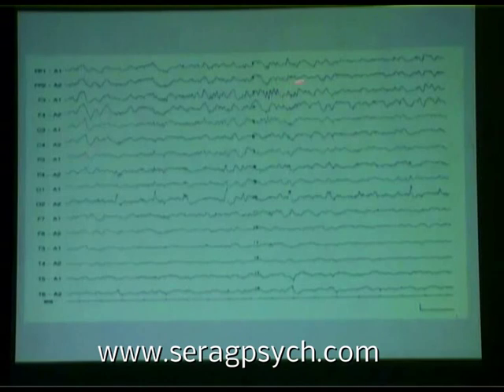You go up here, okay? So if you see any spikes at FP2-A2, unless you really have some concern from other montages that it could be up here, but if it isn't, and you don't see any spikes here, you know that before you started there weren't any here. If there are no spikes, then you know there's none here. If there's none there, then you know that this is all from A2. That's how you check your reference out.